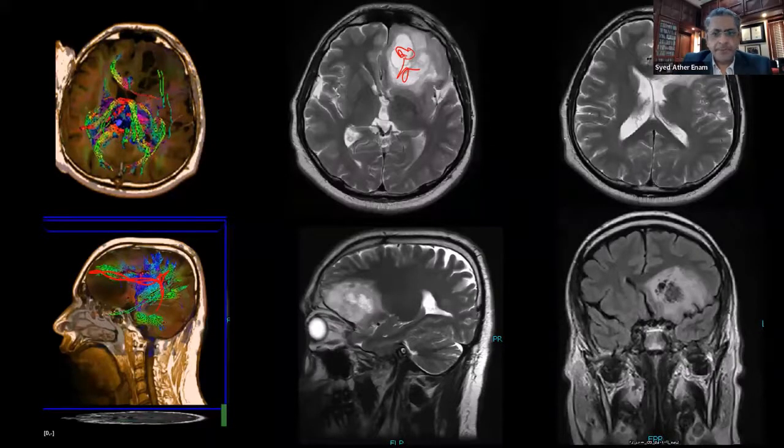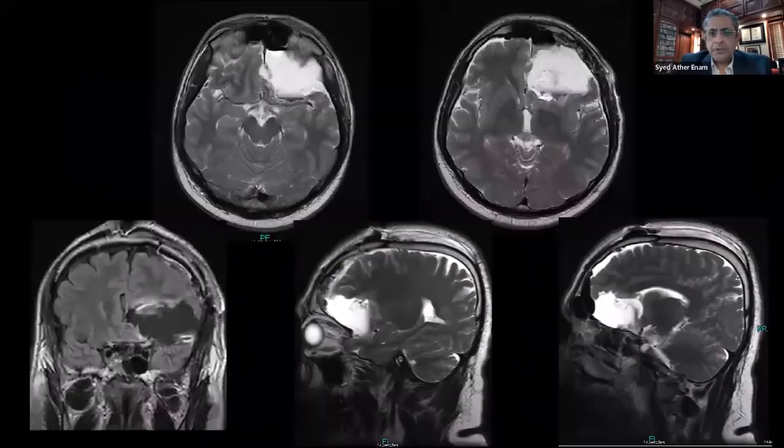So okay, all right. And again, always keep in mind you have to look at where it is present, what kind of effect it's producing. It's causing a midline shift, mass effect, extent kitna hai. Because as a surgeon, you are always thinking about how am I going to take care of this tumor. So you're constantly assessing the tumor as you're looking at it. Yeah, so this is the same tumor which was removed surgically, awake craniotomy, and even if there was no DTI, this could have been a good resection because we were monitoring it. So DTI is not a necessity.